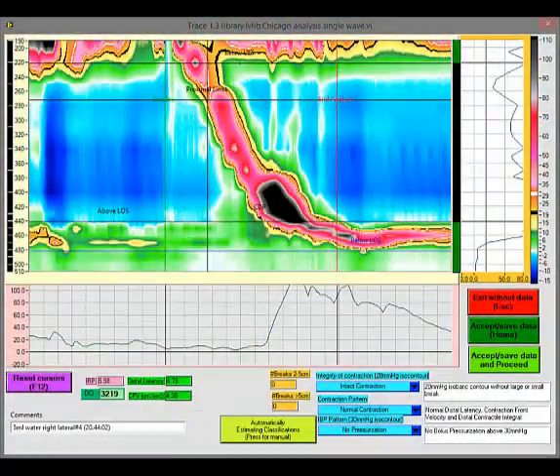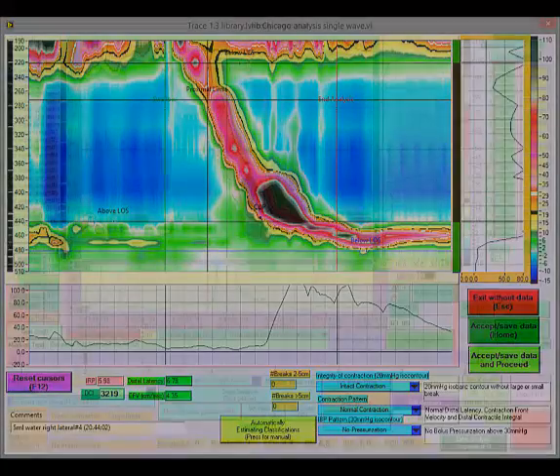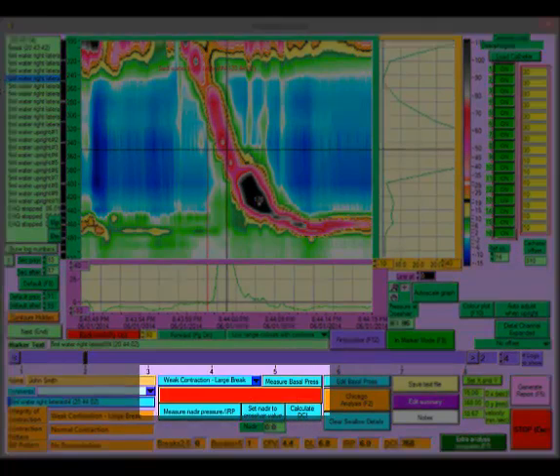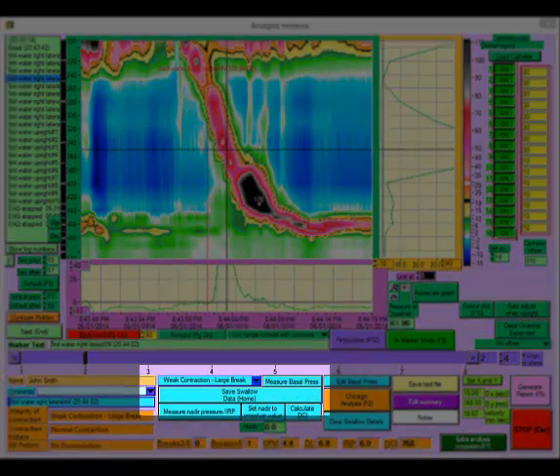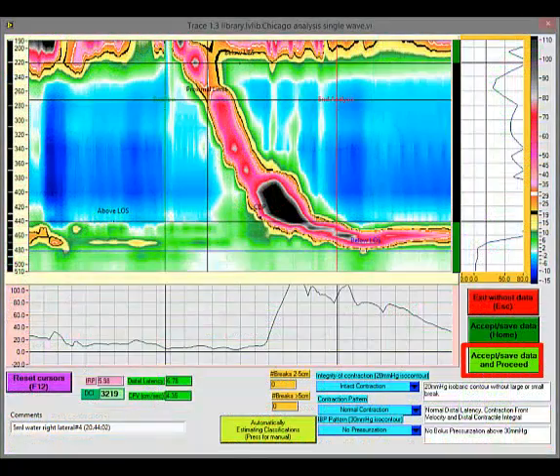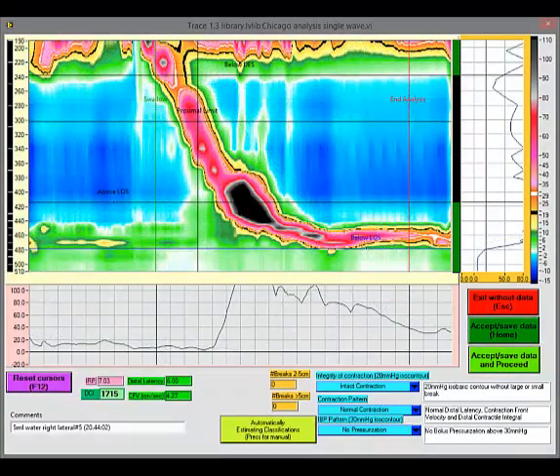When you are satisfied with the data and classification, click on Accept Save Data to return to the main analysis screen. When you return, you'll note that the Save Swallow button is flashing to remind you that you need to save the data. Alternatively, you can click on Accept Save Data and proceed. This will automatically press the Save Swallow and Chicago Analysis buttons, returning you to the Chicago analysis screen with the next swallow automatically loaded.